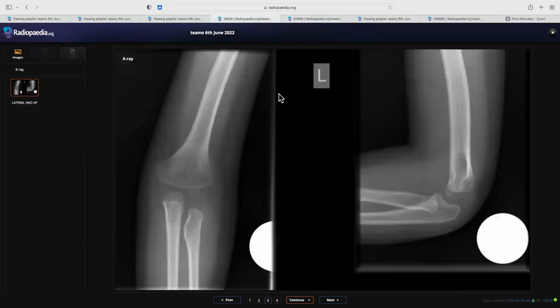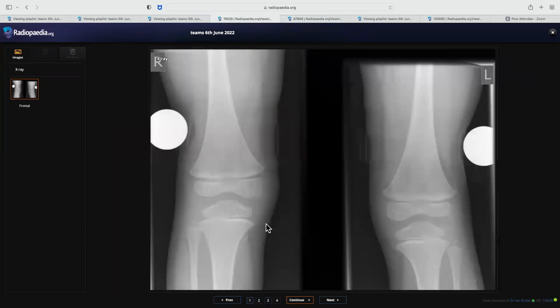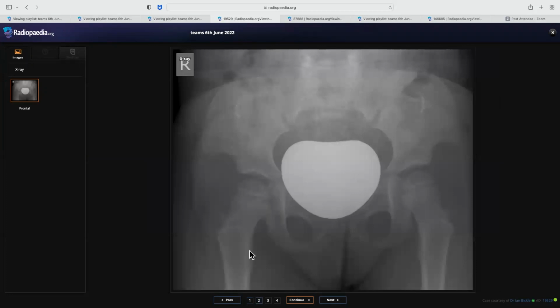This one, so see, this was a case. Such cases they do show, and they start like this only. So there is no patella. If you can see, yes, no patella here, right? So that's a case of, and you also said, Nail-patella syndrome. That's why I came back to this X-ray again. I thought now you will pick up the patella, but maybe you didn't remember the spectrum at that particular point of time. That's perfectly fine.